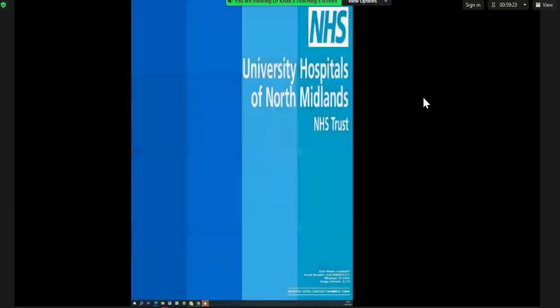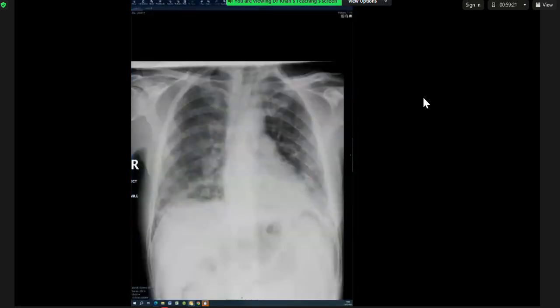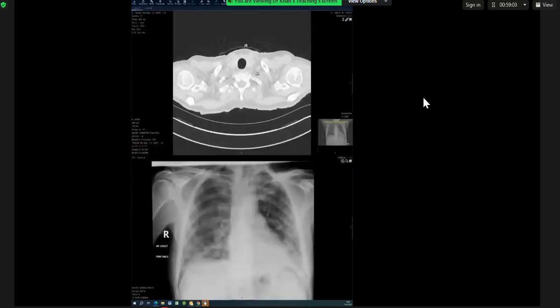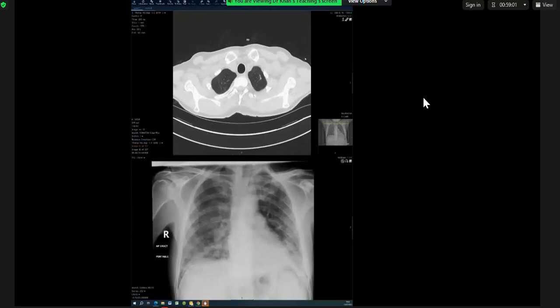So you're suspicious for pneumonia? Pneumonia or multiple nodules in the lower lungs. Okay. So the patient is well, they only have a cough. What kind of pneumonia do they have? If the patient doesn't have fever, then it doesn't go well with pneumonia, as pneumonia causes constitutional symptoms.